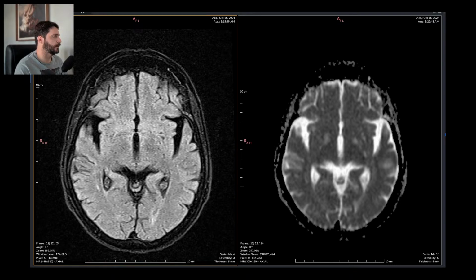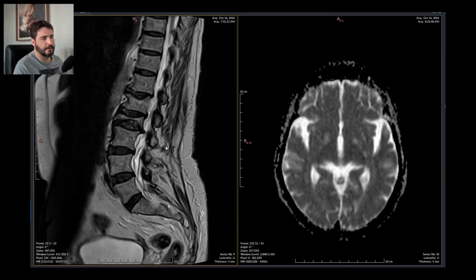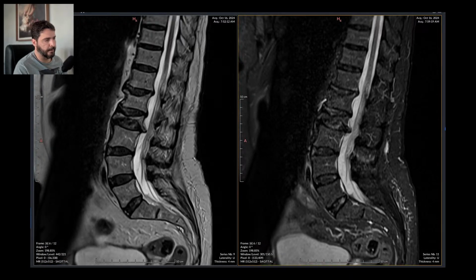We are done here. So let's finish this up and move on to our lumbar spine, because lumbar spines are much easier than brains with tumors. Brains with tumors are hard to report, but we survived. So this is a very symptomatic spine for sure. See, chronic, although symptomatic.